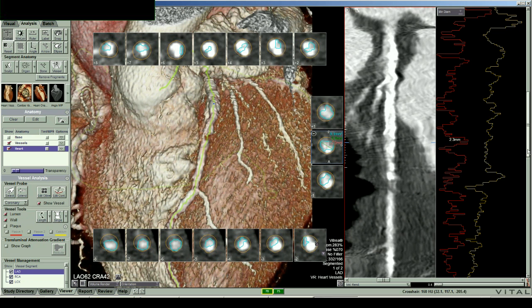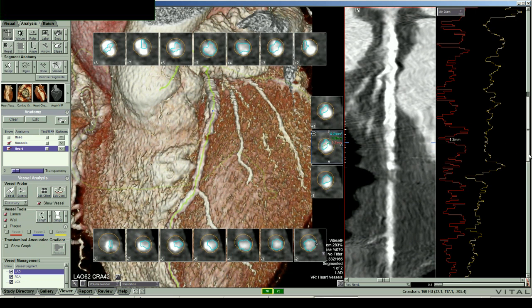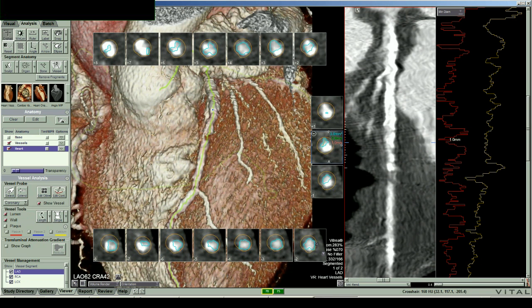So if we start at the top, starts right there. Let's get a ruler, start at the top, bring her straight down. We should be getting down here to, I went too far, right in here, 51, 52, and so we're getting 51.4 right there. So it's the exact same spot, so we can be sure of that.